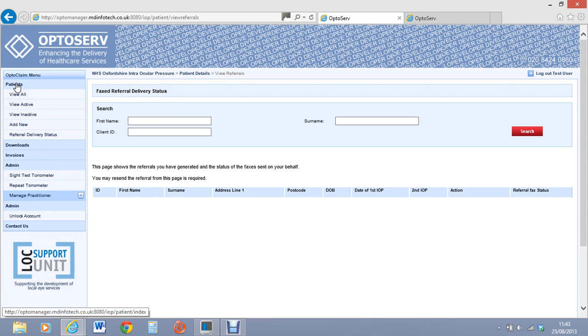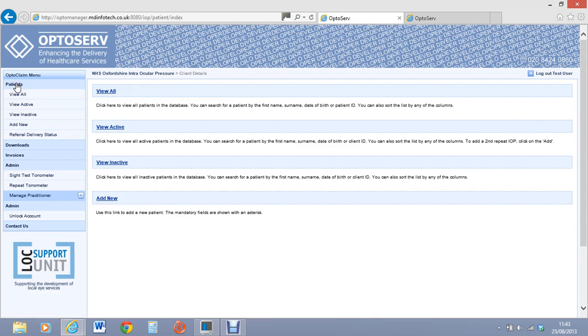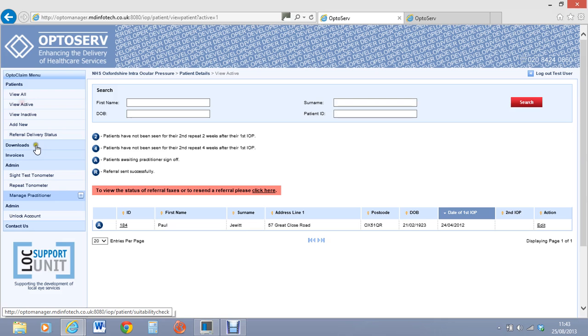Right. Now what I wanted to do is just go back to this final patient that I've got on here, so view actives. So it's me, and what happened was I came in for an IOP, had it done in April time. I didn't come back in for the second IOP. And after a month I said to my staff, look, this patient's not coming back for the IOP, could you set up a referral and I'll refer them in. So the staff did it, and it's awaiting my signature, but I never went back in and edited it. So I never actually closed the patient down.